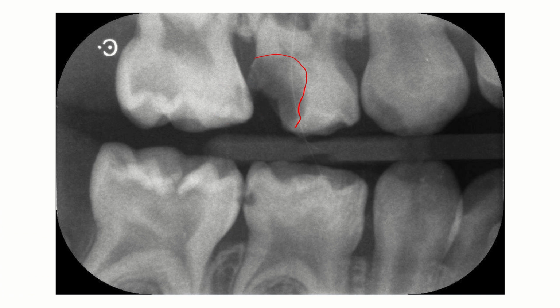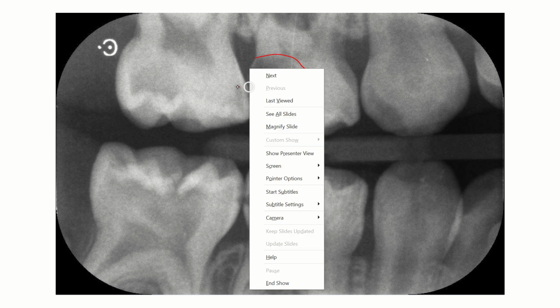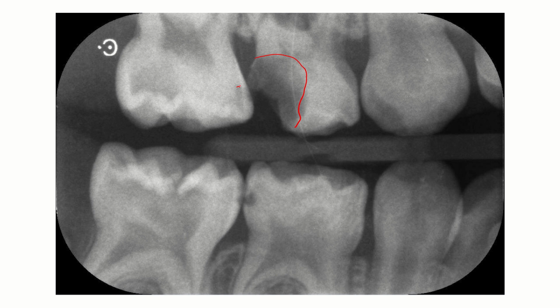And RA2 would suggest that the caries had remained within enamel, but in actual fact, if I draw the outline of this lesion, whilst it starts in enamel here, it comes round here. So that lesion is definitely into dentine.